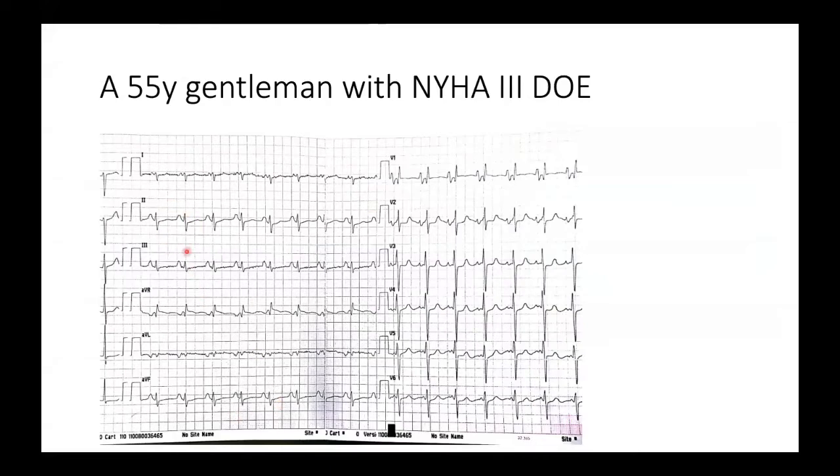But if you see lead 2, as compared to left atrial enlargement, here the P wave in lead 2 is significantly tall. So it is also known as P pulmonale, where the lead 2 P wave is more than 2.5 mm, and in lead V1, when you see the P wave, it should be more than 1.5 mm. So that is known as the P pulmonale.